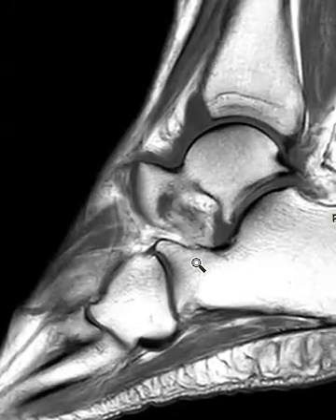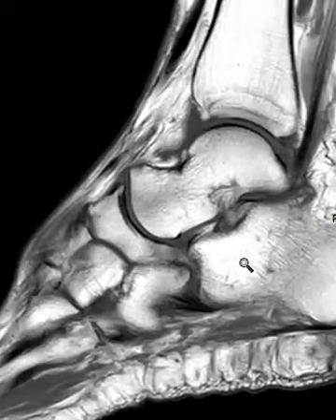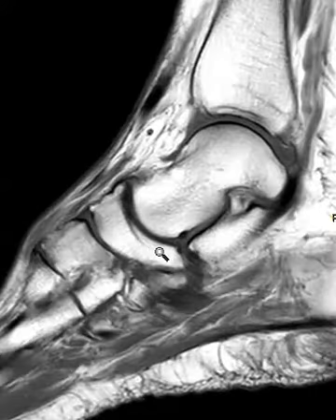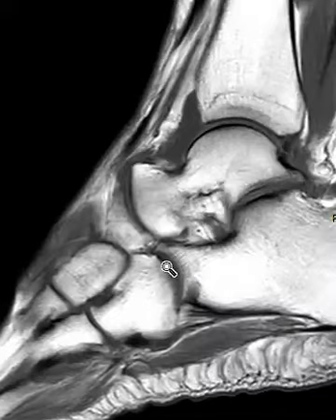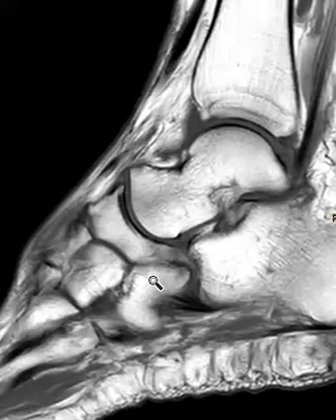Usually there's a little gap. Here there's not much of a gap. We only see on one view where they touch each other almost, but it looks like maybe a calcaneo-navicular coalition. But if we go one more cut over, we see really the coalition is between the cuboid bone and the navicular bone. Here's the navicular, there's a cuboid underneath it, and we can see that it's in a cuboid-navicular or navicular-cuboid coalition, which is, again, more rare.